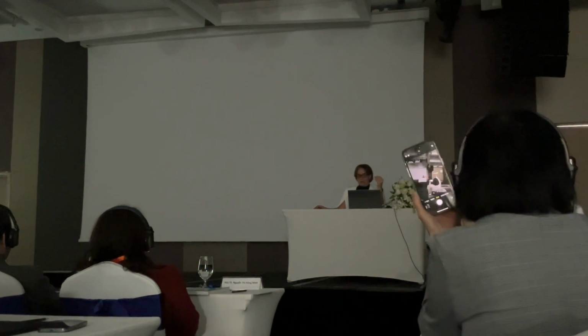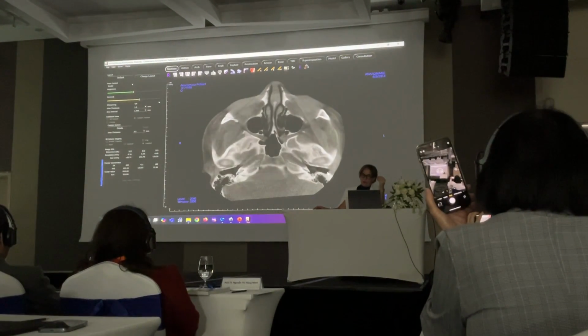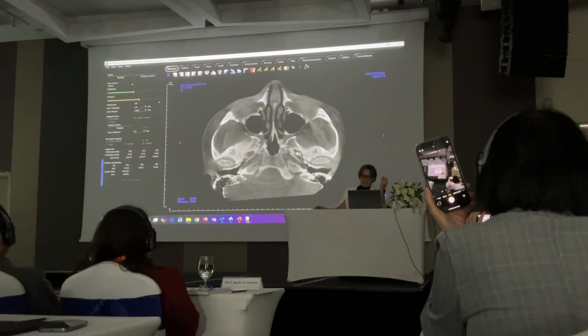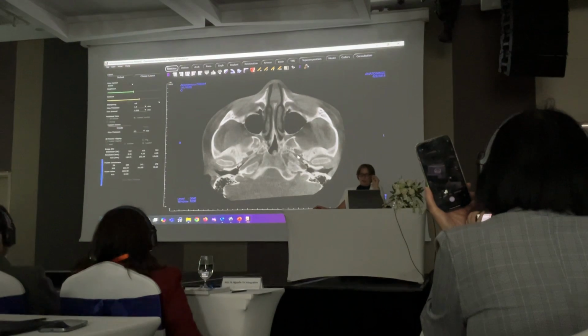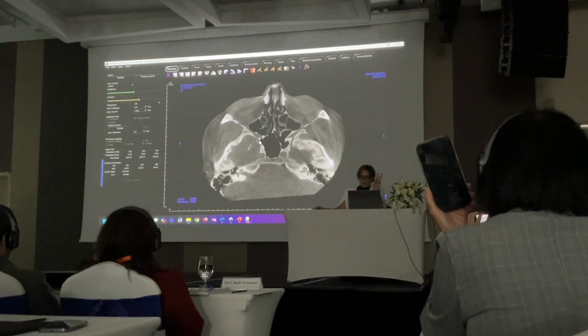Here we have the ear structures, the inner ear, the middle ear, the mastoid air cells, and of course the external auditory canal. Okay? All these things I'm telling you is very complicated, but until you learn it, you can have a radiologist help you. This is called the Vidian canal. This is foramen ovale, okay, where the mandibular nerve goes through. This is foramen spinosum, that has the middle meningeal artery. This is rotundum, which has the cranial nerve, trigeminal nerve second division go through, okay?